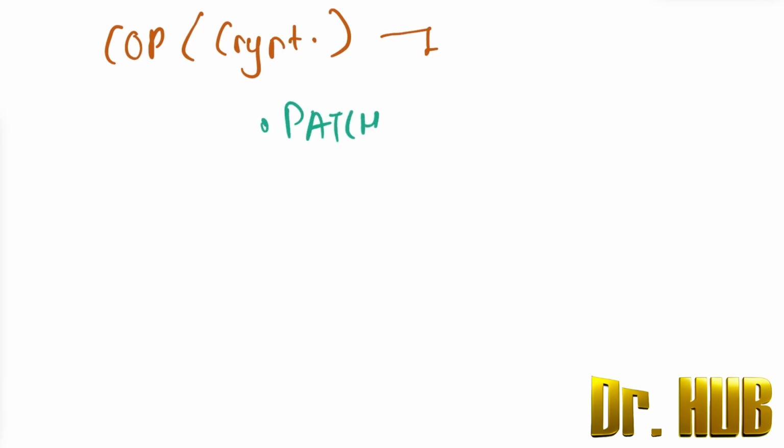Next, we look at the COP. What is meant by the COP? COP means cryptogenic organizing pneumonia, and this has the presence of patchy consolidation, with air bronchogram.